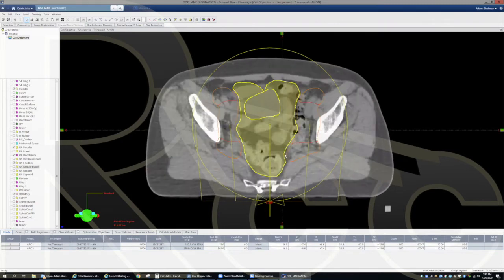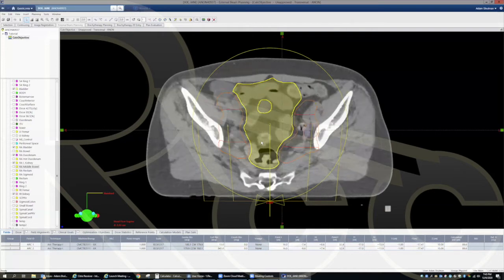A lot of these organs at risk are well below tolerance, but that doesn't mean that we can't push them. So you'll see that I'll push on everything, no matter how far below tolerance I already am. I think that's an important thing, especially when you get into higher doses, things like head and neck, and the tolerance dose of, say, parotids, a mean of 26 or 24, whichever is used. These are all probabilities, so the lower that we can get, the better.